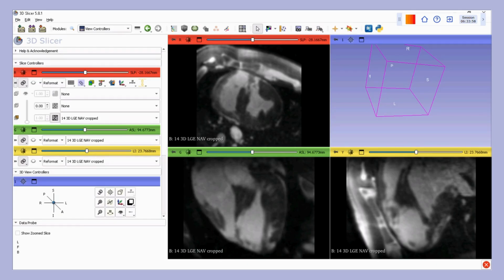So now we will go through the manual visual overlay. This is a quick and easy tool that you can use within the View Controllers tab that allows you to essentially lay the registered image on top of the original fixed image, or any image on top of another, for convenient viewing on how well aligned the images are.